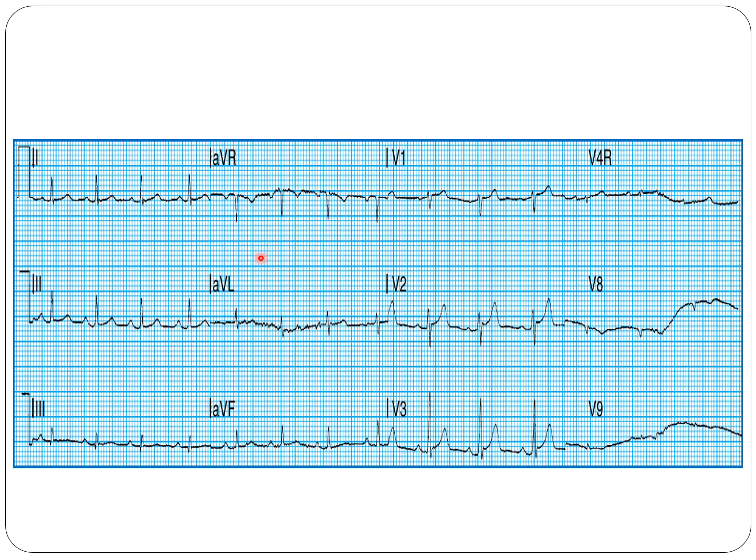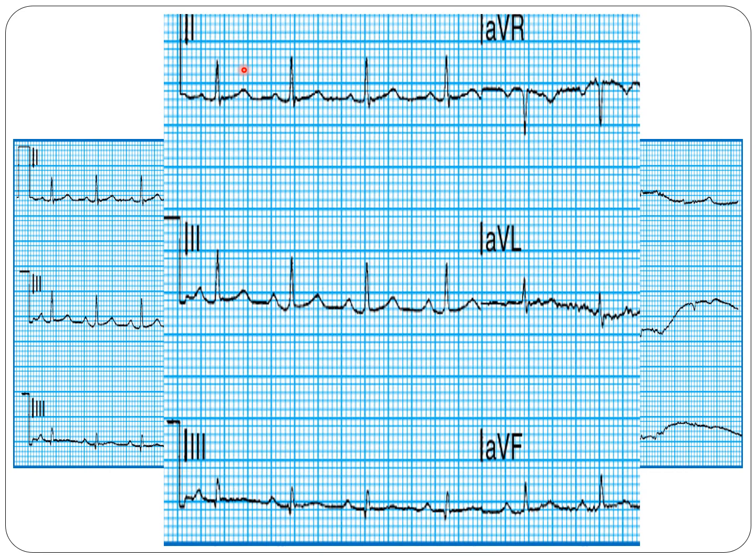In the next one, you can say that this is rhythmic again. The heart rate is around 1, 2, and 3, around 100. Sinus, PR normal, P is normal. The QRS is narrow. The axis around 1 positive, AVF positive, is normal. Lead 3 is still positive, so this is over 30. So this can be 40 or 50.